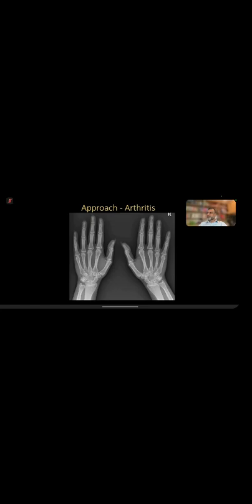And we're not talking about the feet, we're talking about the hands. So if you're looking for erosions on the hand X-ray, when you're doing a ball catcher view, you can see these erosions better as compared to the normal dorsal palmar X-ray, or PA view, or AP, whatever you want to call it. Okay. So always look on the radial aspect. Ulnar side irregularity can be normal. Ulnar, normal. Okay. Remember normal with the N.